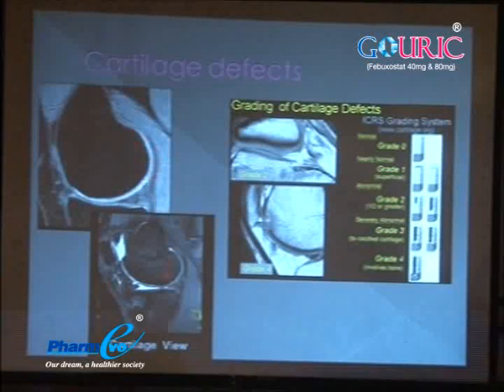And that's what a normal cartilage should look like. This bright area, which is very nice and concentric, and there are no defects in there. But if you look over here, in this same thing, there is the cartilage there, and you see a defect there. So these cartilage defects can again be picked up very beautifully on some of the MR images.